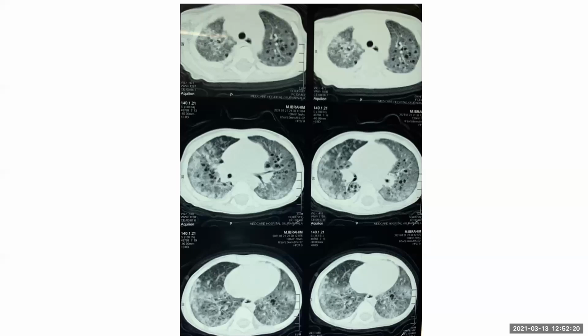If the inflammatory markers are raised, then this is more in favor of an infective etiology. I would also like to see any previous imaging if available. The previous imaging also showed these lucencies, these small cysts in the lung, but the opacities were not there. Okay, does anything click in your mind?